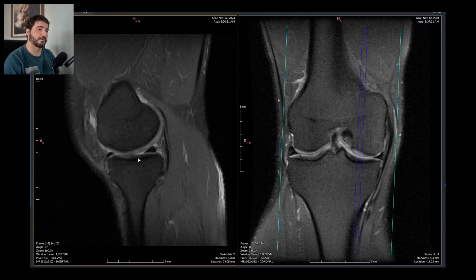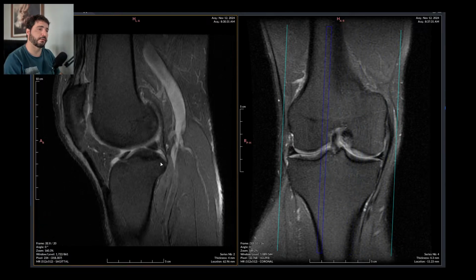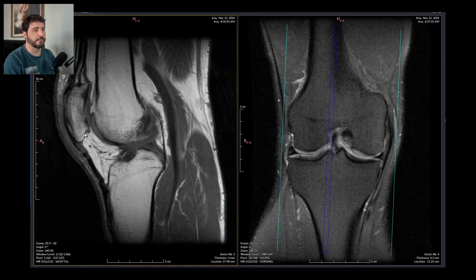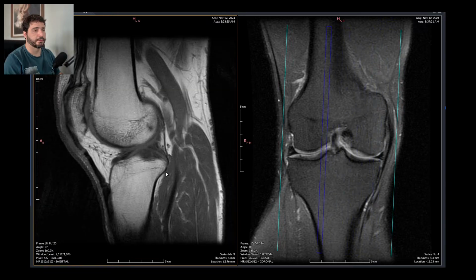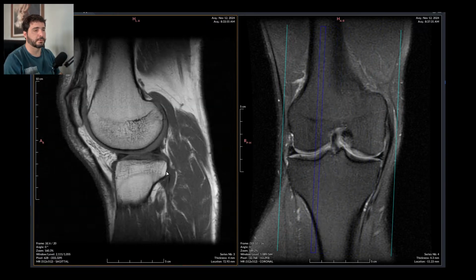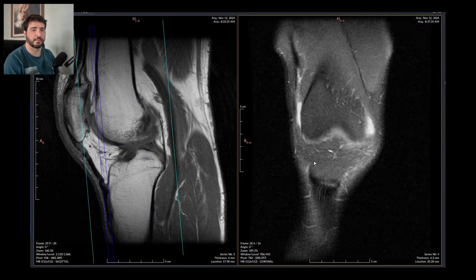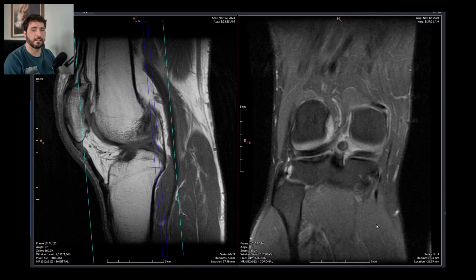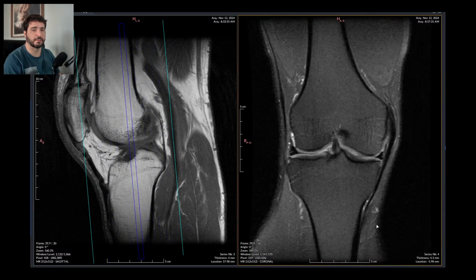The meniscus seem fine. Yep, anterior and posterior cruciate also fine. Yes, arthrosis on T1, that is very clear. Seems like this is it. On coronal, the meniscus seem fine. This is a 4.3 thickness scan, so this is a very poorly done scan.